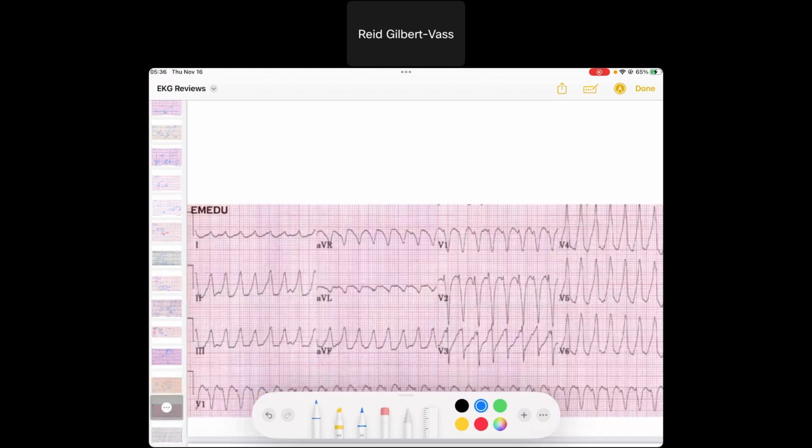Alrighty, next. Here we've got a regular rhythm. It's rapid. It's about 300, 150, so maybe 180 beats per minute. We know sinus tachy doesn't go that high. These are wide, complex QRSs. If you can see here, wide, complex QRSs.